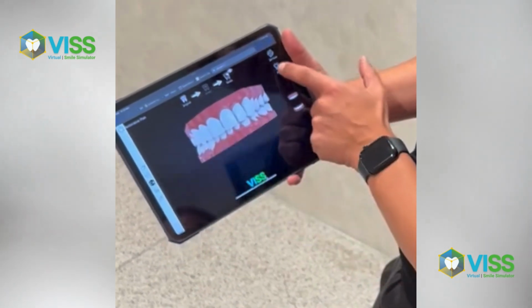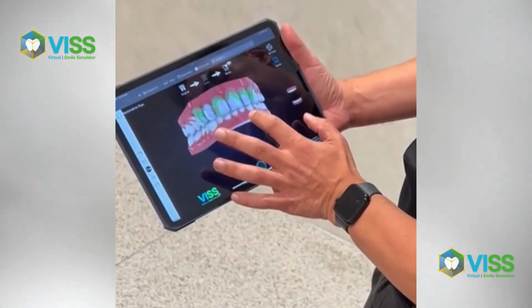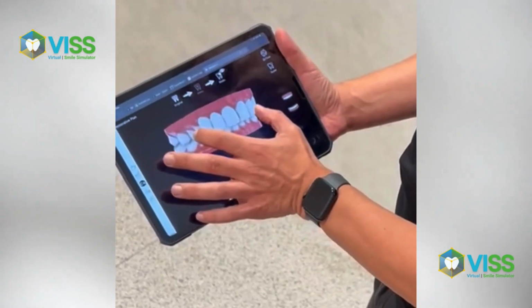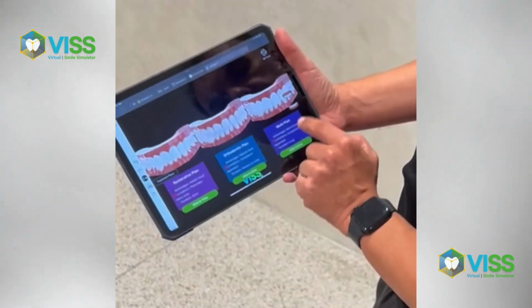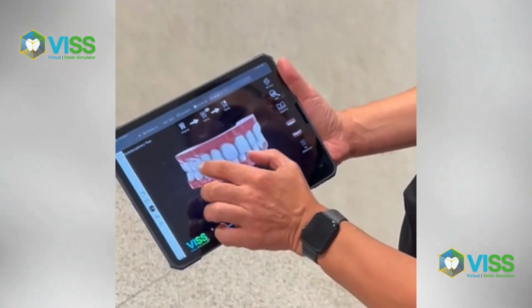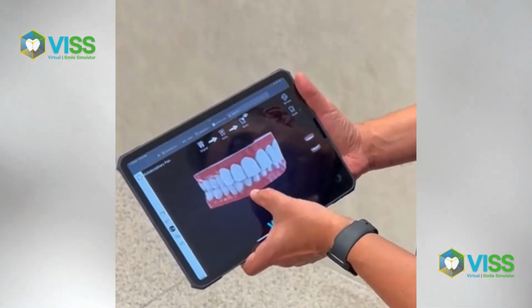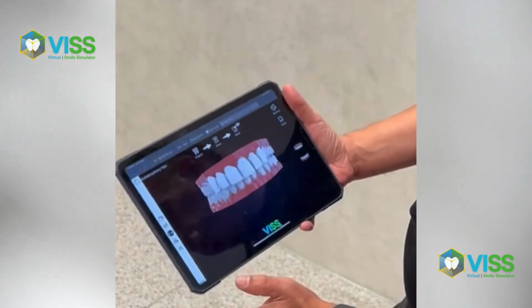And we can also guide the preparation. So we want to do minimal preparation. So you can see how the veneer option is still a nice option, but it leaves your middle arch narrow. So if we go to the combined plan and show you what the aligners would look like, the fuller smile, and then enhance the teeth with either bonding or veneers, you can see how that's going to give you a better result. But it's hard to show that to you without seeing your face.